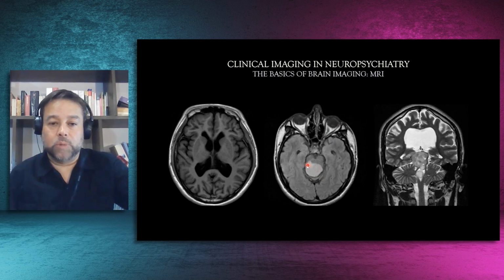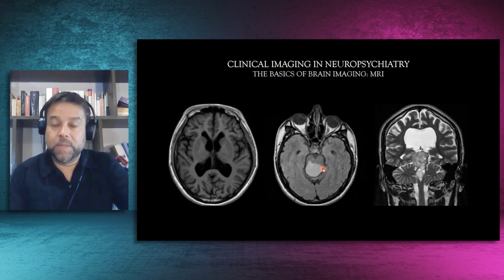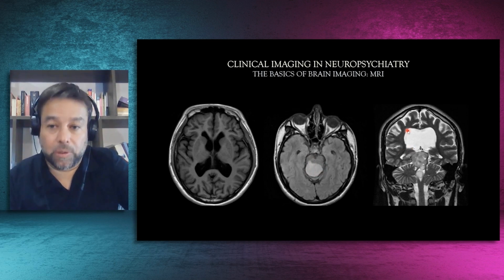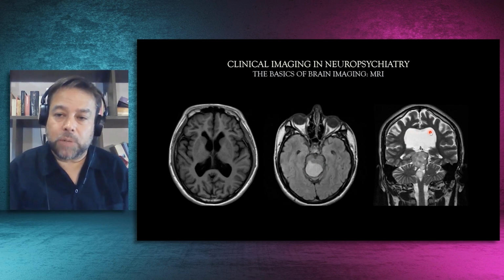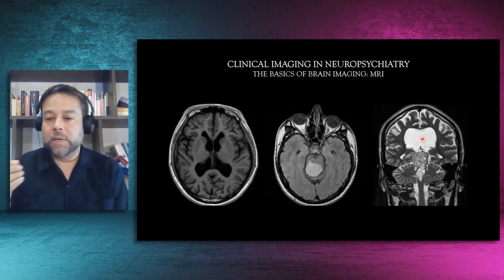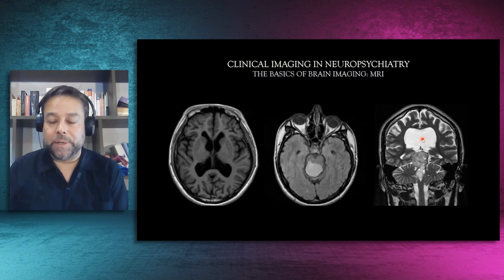This is a case in which we can see a brain tumor that is affecting the brainstem. This is a very important lesion because it can lead to a pathological problem that is hydrocephalus. This is another sequence. On the right, you can see a T2 sequence. The water looks very bright. So we will say that the liquid or the water inside the ventricle is hyperintense.